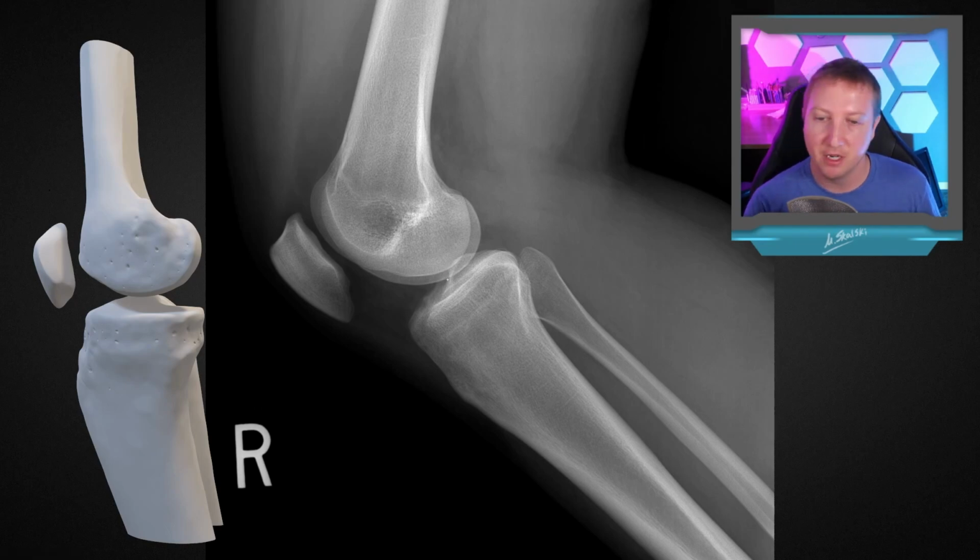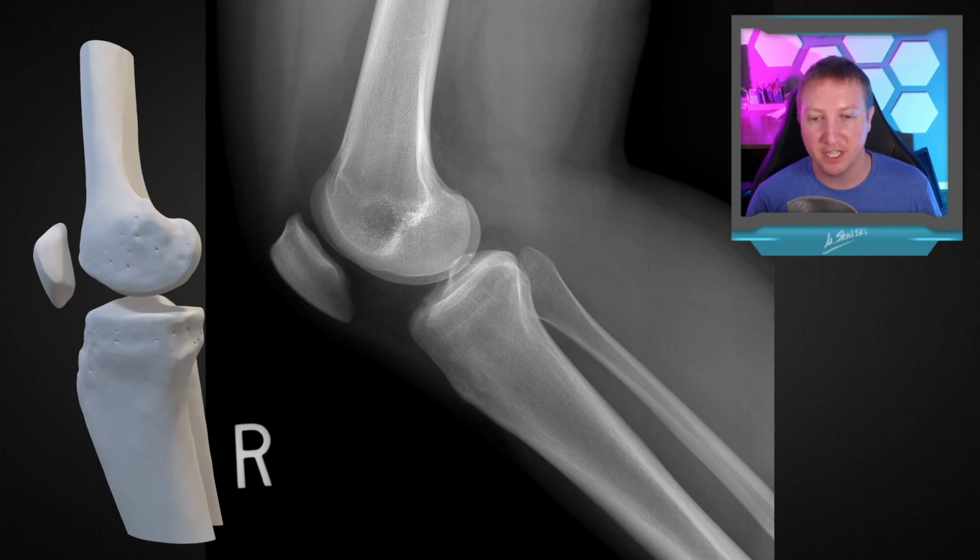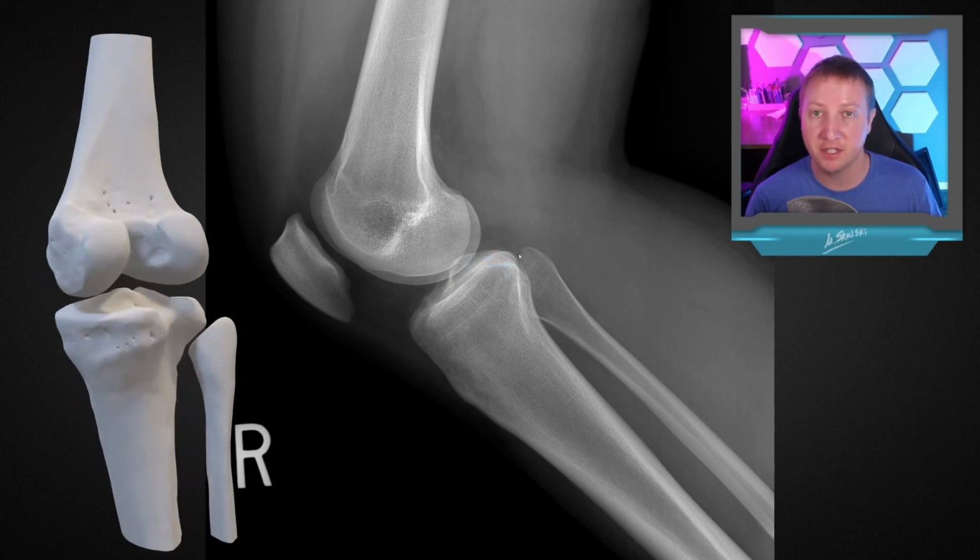Now let's talk a little bit about the proximal tibia. We already talked about the tibial tuberosity, and those tibial spines we saw on our A to P are going to project here, and they're side by side, so they're going to be pretty well superimposed if it's a good lateral. You can see there's a little bump here for our ACL attachment, which is going to come up in this orientation. And then notice that as they come back here, we get this sloped portion along the back of our tibial eminence.